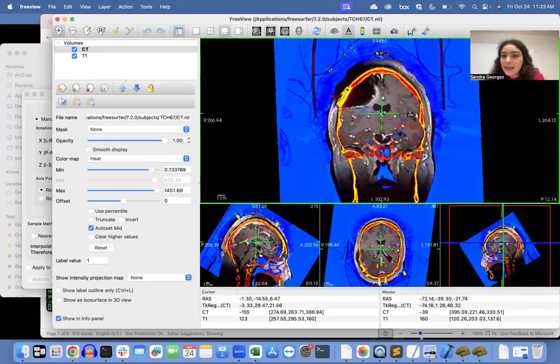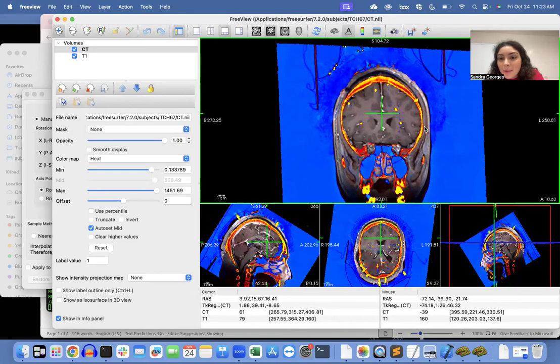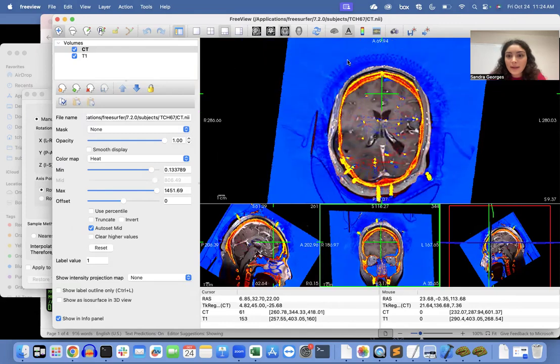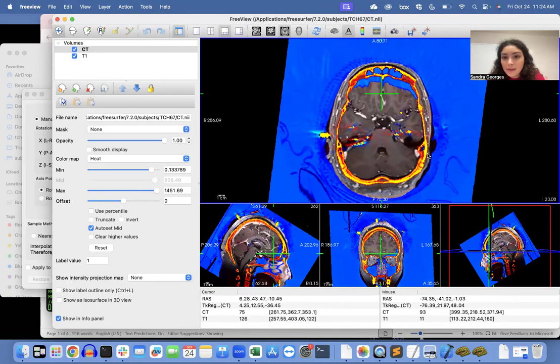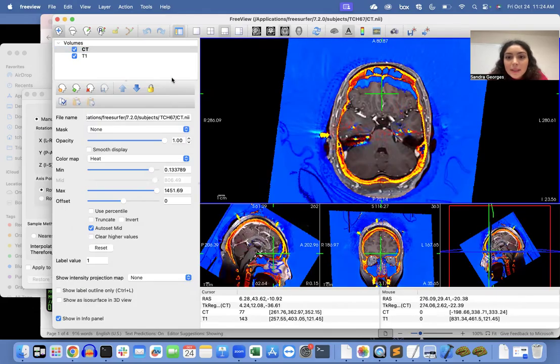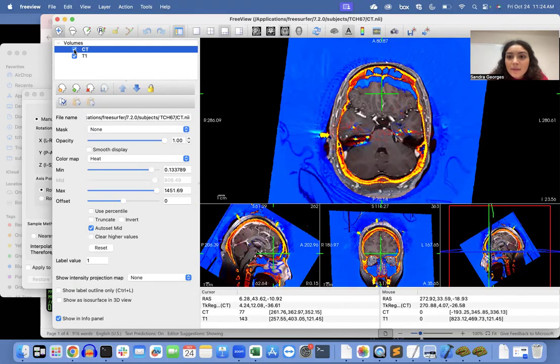I think once you see the scans a couple of times, it starts to make a lot of sense. In the first couple of tries, it might be a little difficult to see the landmarks that you want, but definitely with practice, it'll be good. So here we are again, if you wanted to toggle on and off, see how it fits perfectly around. There's a little section here that I'm looking at, see how it's covered on and off.